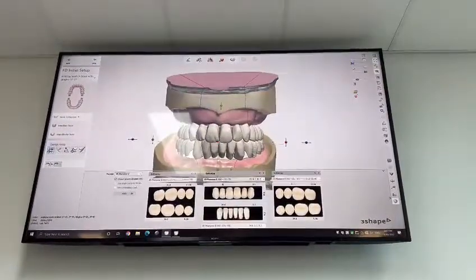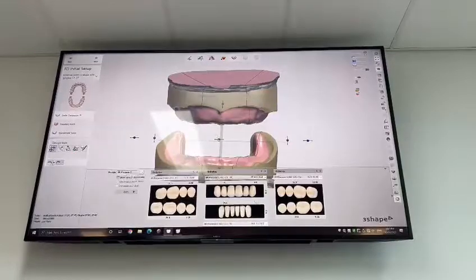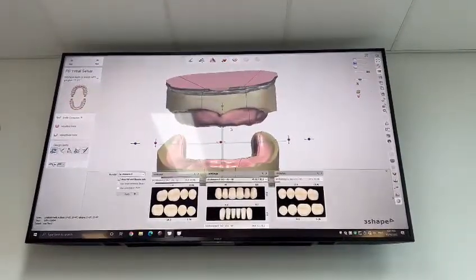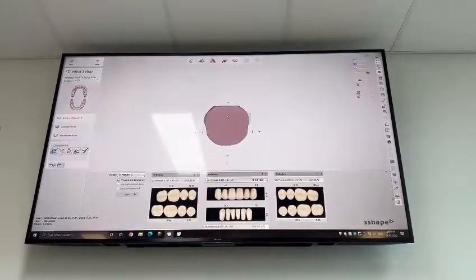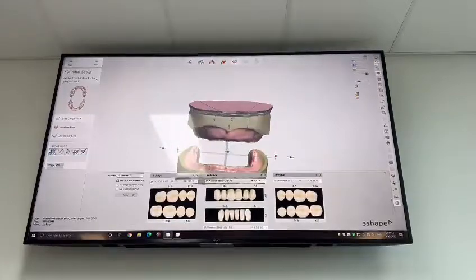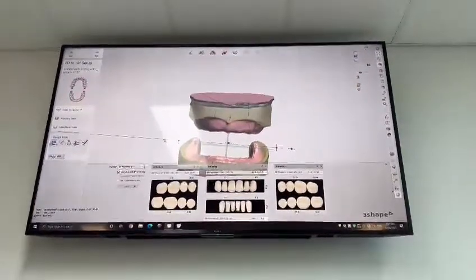And if we turn these lowers off, we see this is our occlusal plane. Can you see what I'm saying here? So you can actually turn the teeth off and start to adjust it this way. It needs to come a bit that way. There's our midline through there.